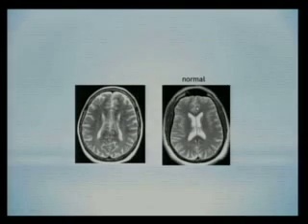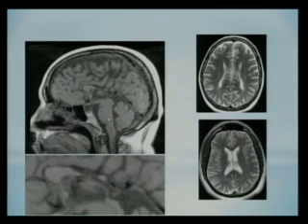Okay, now, corpus callosum dysgenesis. Normally when you are at the mid to higher level in the head, you shouldn't see almost parallel lateral ventricles. You should see something like this. If they're parallel like that, that smells of dysgenesis, of which this is an example here.